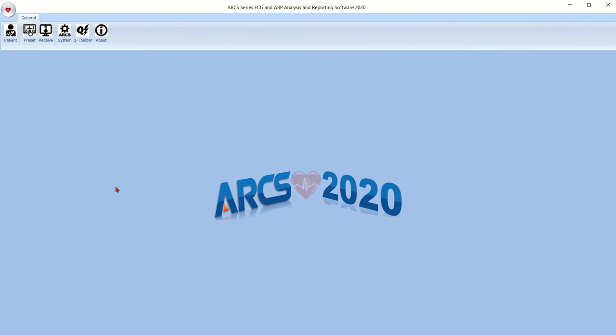Welcome back to the ARCS 2020 ambulatory blood pressure education video. In this second video, we'll take another step into the operation of the ambulatory blood pressure software. We'll begin with the patient icon.